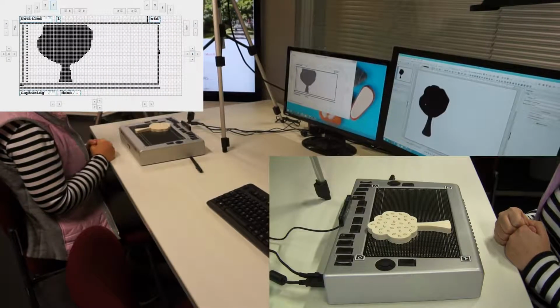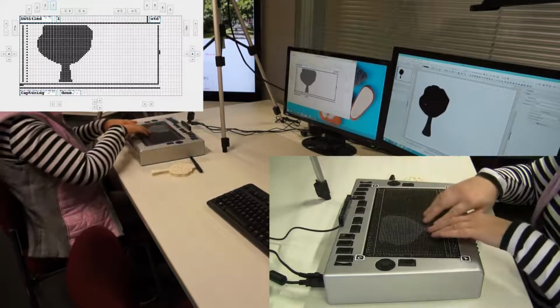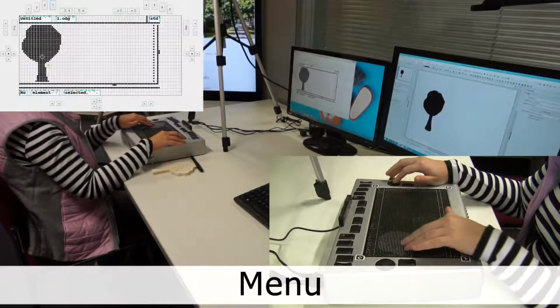Object detected and added. The silhouette shape is placed at the same position as the real object. The user can freely manipulate the captured shape afterwards. Predefined standard shapes can be chosen out of a set of shapes.